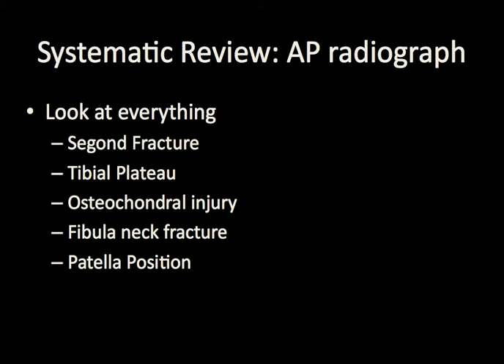A fracture may be pretty obvious, however, we would try to exclude the presence of a serious injury by looking at subtle signs of that injury on the radiograph. Segond fracture, tibial plateau fracture, osteochondral injury, fibular neck fracture can be missed if one does not look for them actively, and also look at the patellar position to make sure that there is no patellar dislocation.